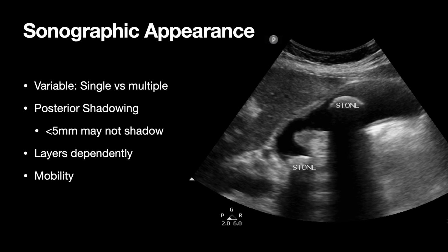One of the patients that I scanned in the last couple of weeks was very much this case, right? We had a large stone in the gallbladder fundus. Great, that doesn't really explain the pain because it moves around. But then when we scanned a little bit more thoroughly and really analyzed that neck, we found one that was hiding in the gallbladder neck. I'm like, there's the problem. That's the one that's causing this patient's discomfort.